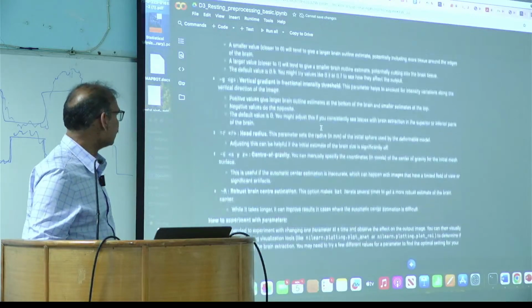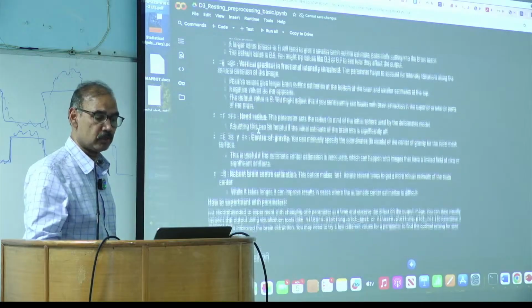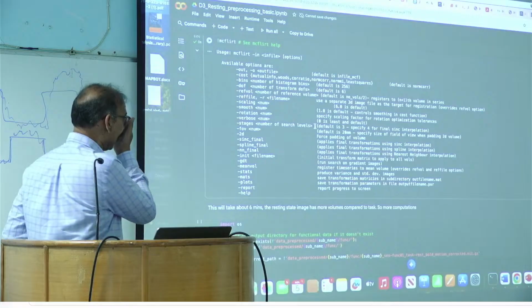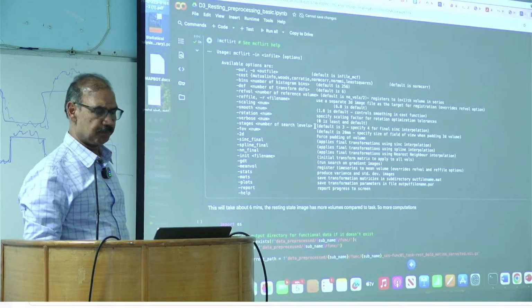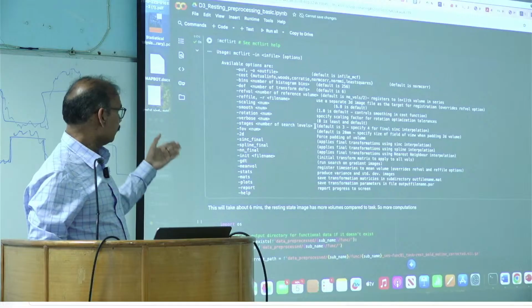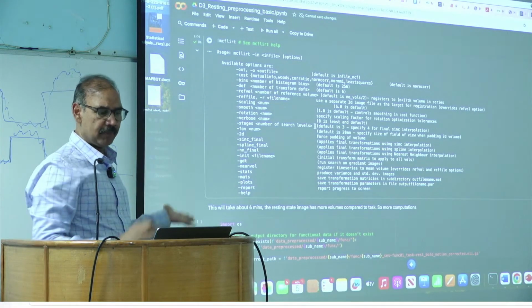And again, as I have said, when you have time, you should go through this because this shows different ways in which you can do the thresholding, right? Then there is MCFLIRT, and again, this gives the option, and this has the cost function, like what criteria to use, whether to use mutual information or normalized correlation or least square, or Woods' approach, where when you have two images, the ratio should be minimal, right? So that is that approach.